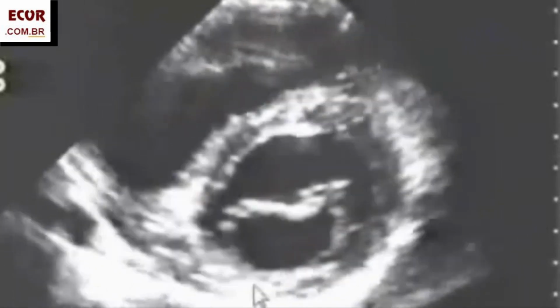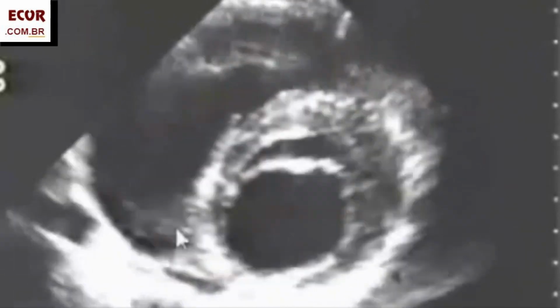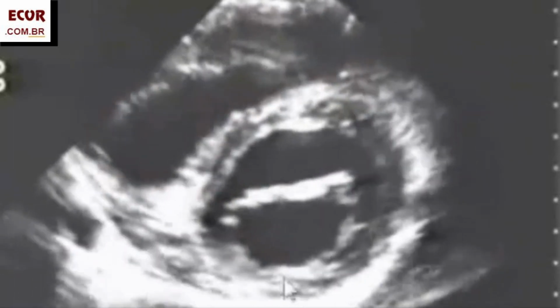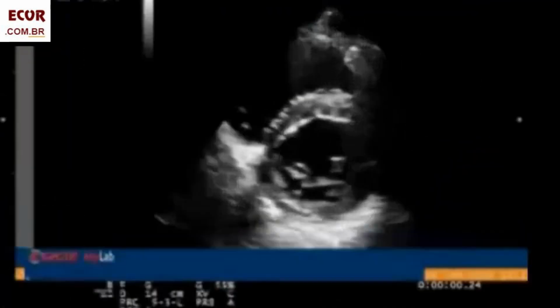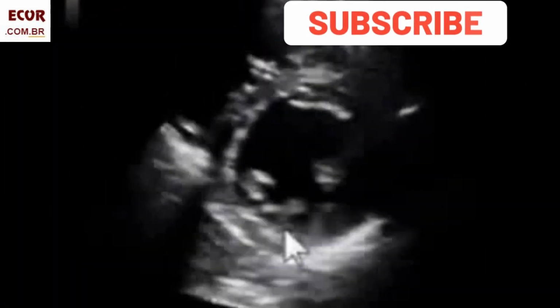In this case here, it's easy to know the difference since I selected this image to show you clearly the origin of a possible mistake. But in some cases, mainly with a bad image, it may be very difficult to be sure. Look at this example here. All the walls are contracting except for this inferior wall that seems to be akinetic, dense and thin. It looks like it's fibrotic.